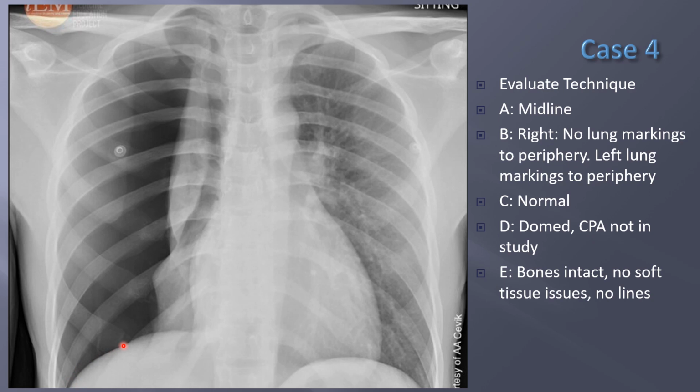Diaphragm is still kind of domed. This one's a little bit higher than the left, as expected, but I'm just kind of cut off down here, so I don't have the full picture. But now that's D. Now we're going to E.